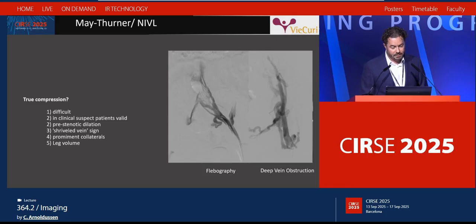If you have more extensive disease, and also a case of post-thrombotic disease, you can see more collaterals here at the rim of the pudendal vein and the pubic bone, and here at the obturator loge, and these are also collaterals that descend through the pelvis to the backside.